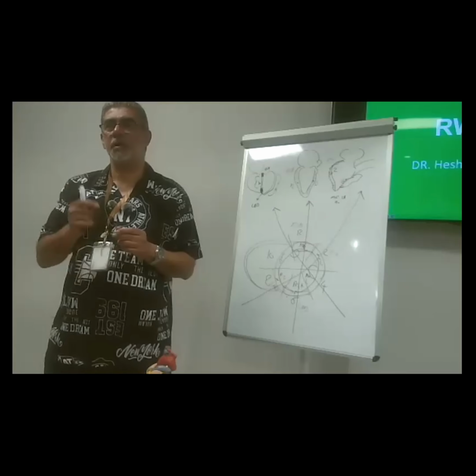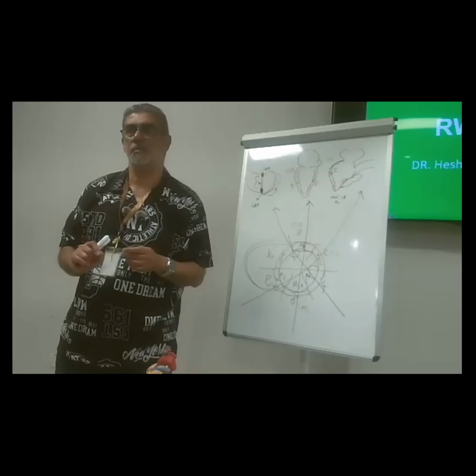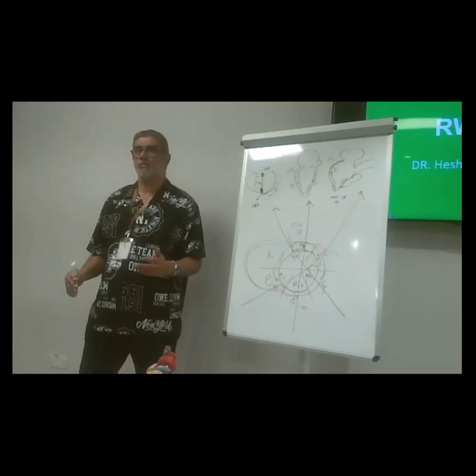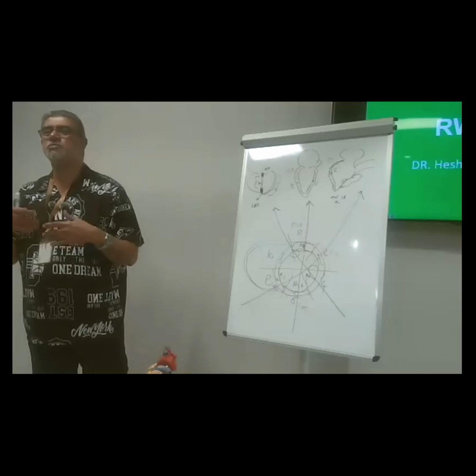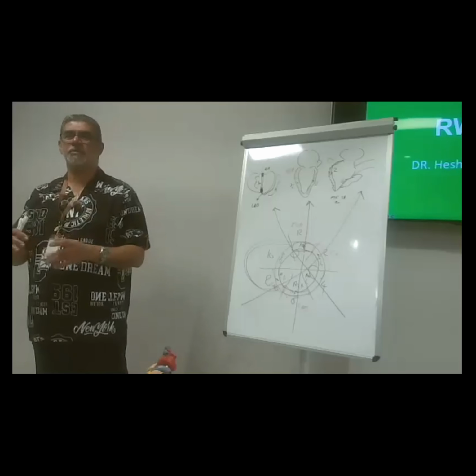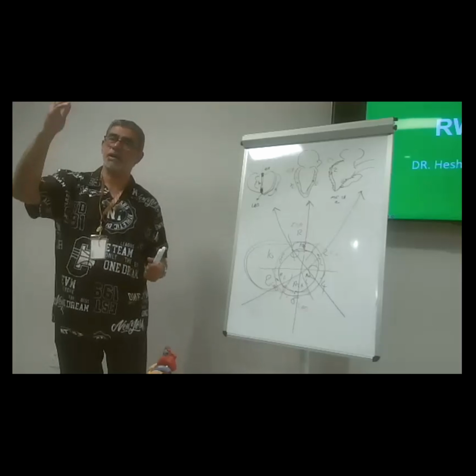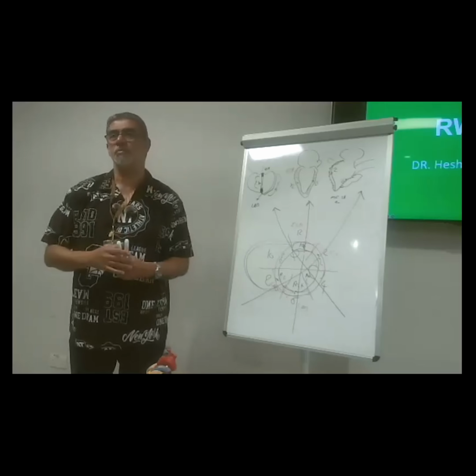You are right. But you need another word: systolic. Because if it was systolic and diastolic, this is aneurysm. Okay? Paradoxical. It's nice. I used to make it opposite, I use the more simple terms, but no problem. So: normal, hypokinesia, akinesia, paradoxical or dyskinesia, and aneurysm.